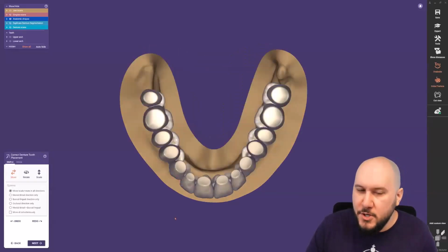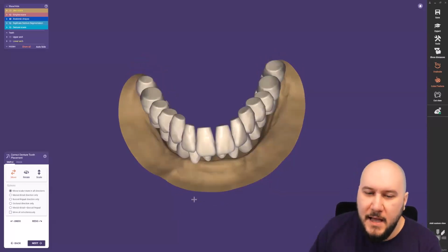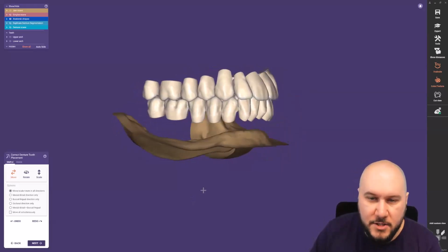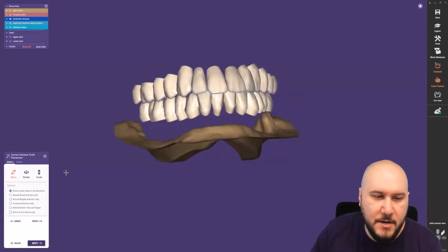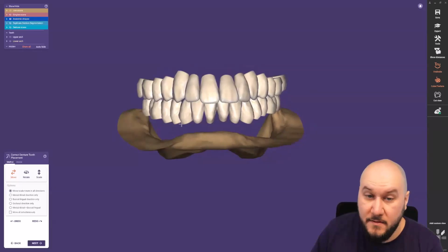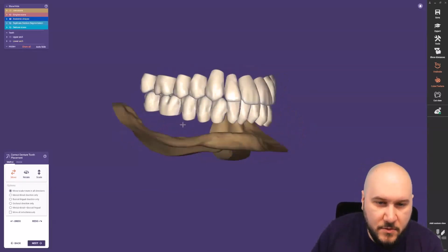This is one of our new features that we have set up since the Elefsina release, the first Elefsina release, not the feature release. The R&D is making so much good stuff in this case. I just saw a couple of things right away there, and there will be cool things coming in the future. We have just started with that one, and it's really, really cool. It makes this duplicate denture workflow really easy and intuitive.